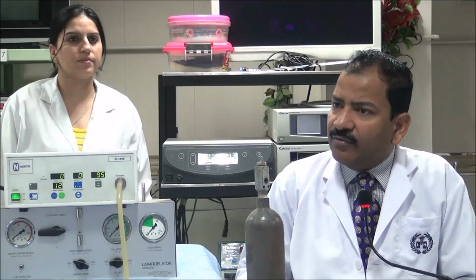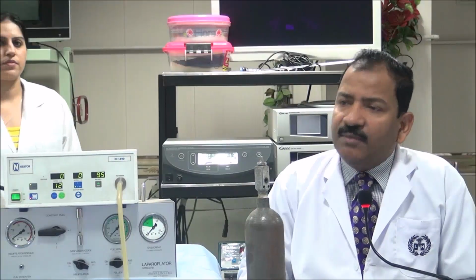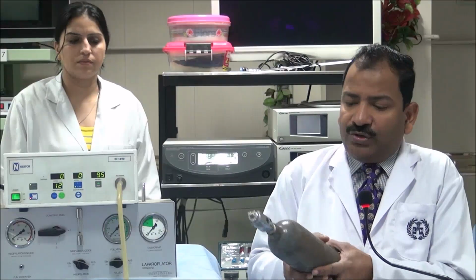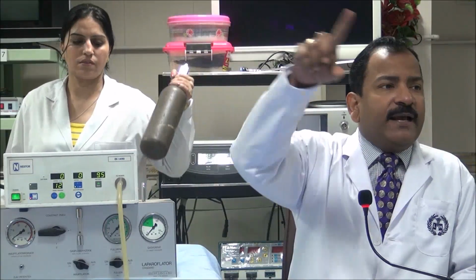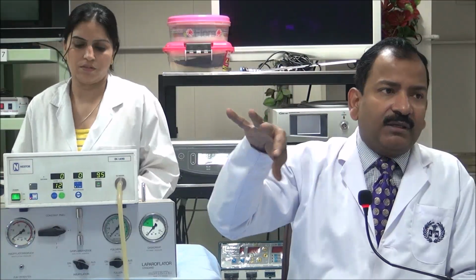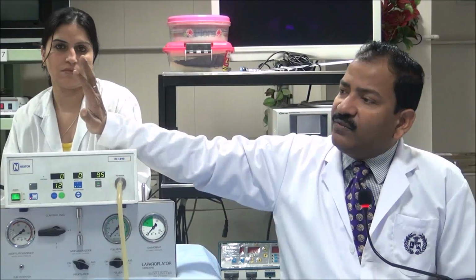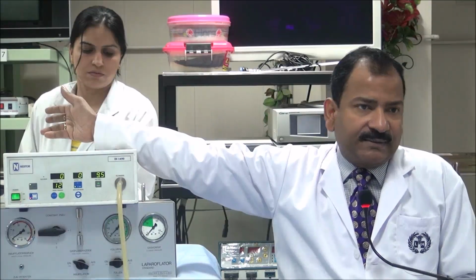So you can perform 1 or 2 surgeries if you are careful. If you are not careful, it will be empty in the middle of the surgery. So it is used by freelancers. Sometimes they keep 2-3 of these cylinders in their car and go from one hospital to another. If your hospital has a central line supply, then CO2 is already coming. Otherwise you can use bigger cylinders, so that with one cylinder at least 4, 5, 6 surgeries can be performed, depending upon how much you are wasting.